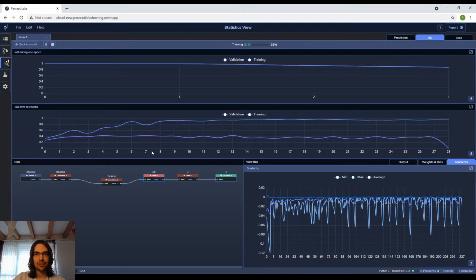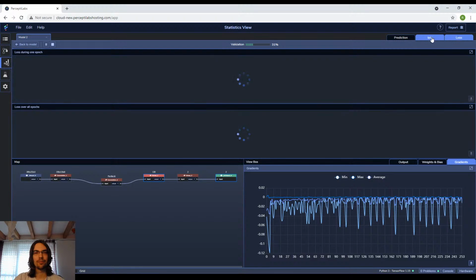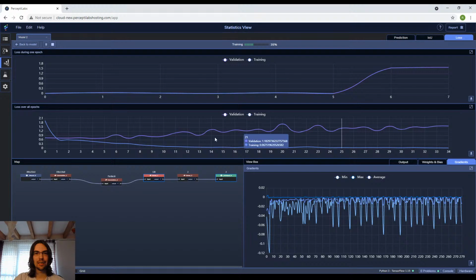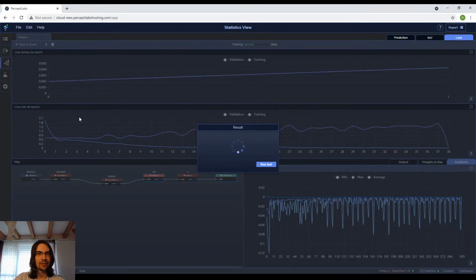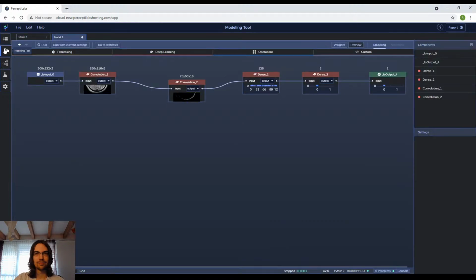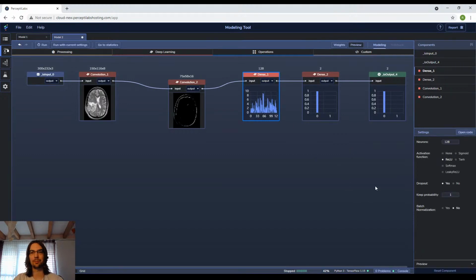We could try with some dropout as well to make sure the validation accuracy is not as bad. As we can see, the validation loss is going up, which typically means overfitting, which is not something we want. So let's throw in some dropout on this dense layer.